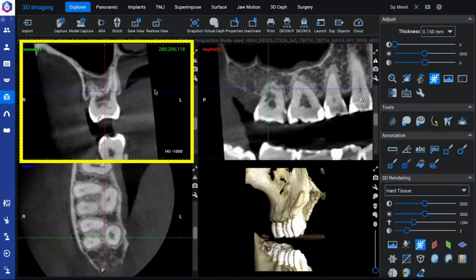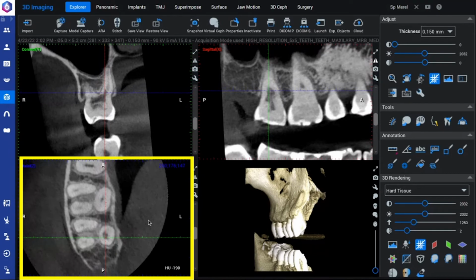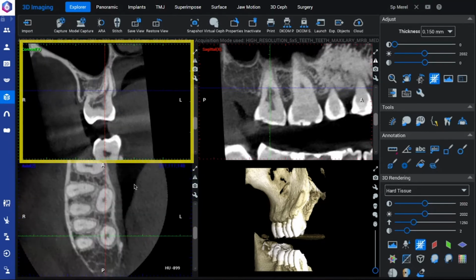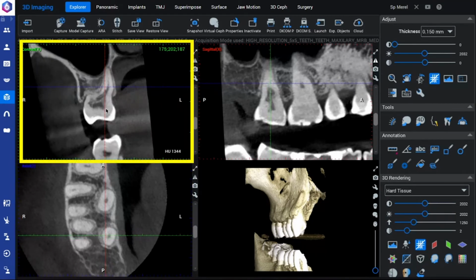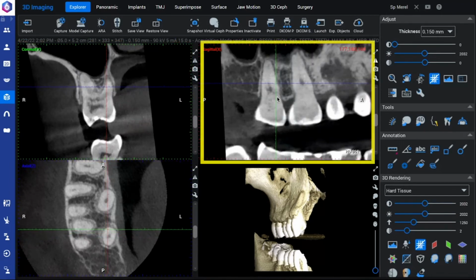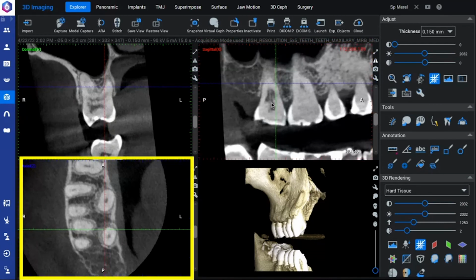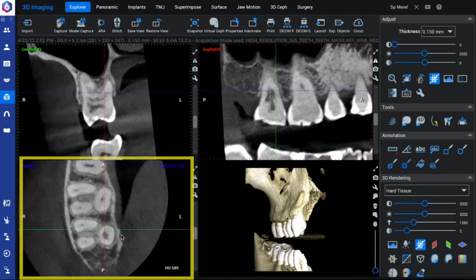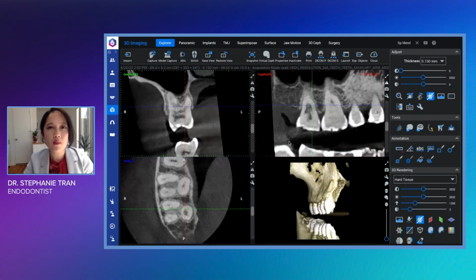For example, we talked about that palatal there, and now we center it. It's extending very far down that palatal root, all the way to that mid-root portion. And we can see it's surrounding much of that pulp chamber and extending throughout the palatal root as well. Here's again little signs of that protective sheath, again confirming that this is invasive cervical resorption and how extensive it is.